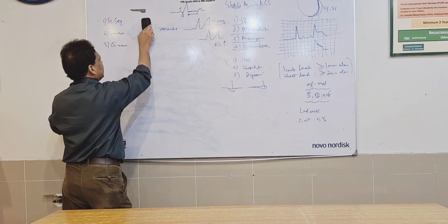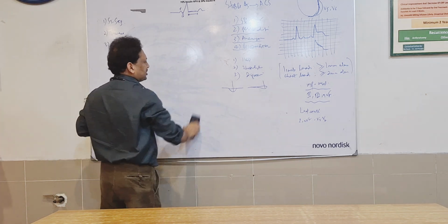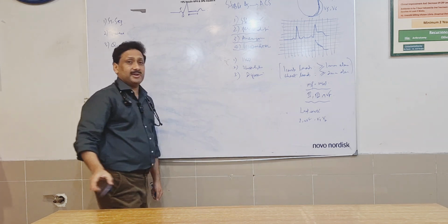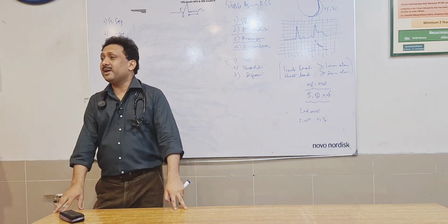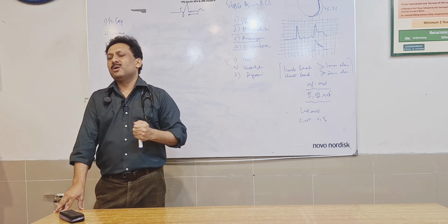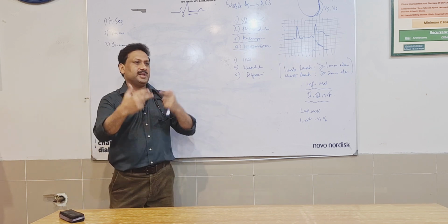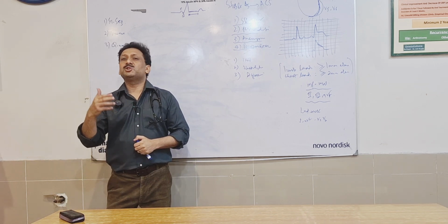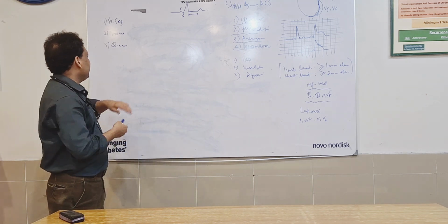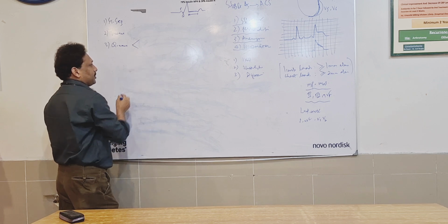And usually when we consider T wave inversion important, or, rather, I shouldn't say elevation, tall and tented or hyperacute, again, preferably in two leads. If you would be seeing this changing in two leads, this would be much more significant. Usually it is not seen in an isolated lead. Q wave is very easy. Q wave, when it is normal and when it is abnormal.